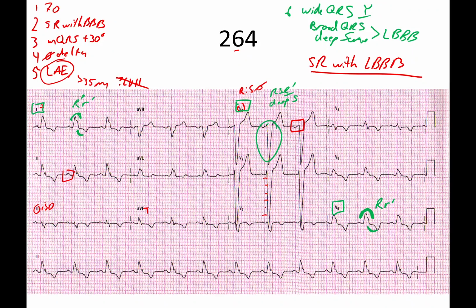The only other thing I would mention here is we have our inverted T waves, kind of exactly where we'd expect them to be. We have inverted T on our lateral leads. But funny enough, we even have them in our inferior leads as well. This patient has quite a few. The only two that aren't inverted are V1 and V2.